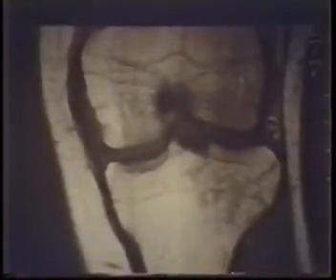But if you have these patients 4 or 5 days after the event, you typically don't see the higher signal intensity on a T2-weighted image. But if they had recent trauma, then this almost always is going to be a bone trauma. And I tend to call this now either a trabecular fracture, a bone bruise, or a bony injury, and leave it at that. But you have to let the orthopedist you work with know what this signifies. Originally, I kind of called it a fracture, and without letting both the patient and the orthopedist recognize what we mean by fracture, that's a little bit misleading. So let them know that the cortex is generally intact on these. Plain film's normal, but there actually is a bony injury.